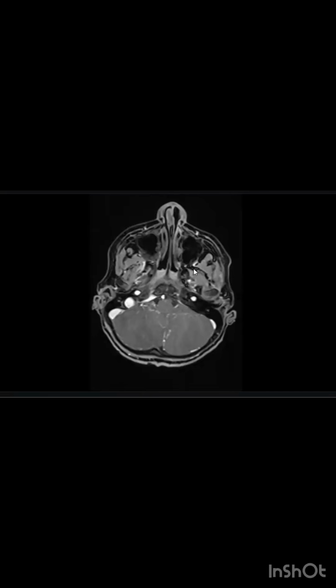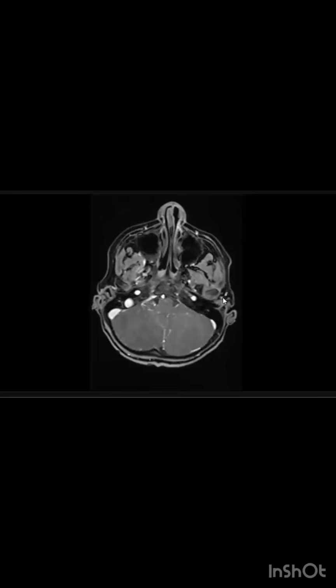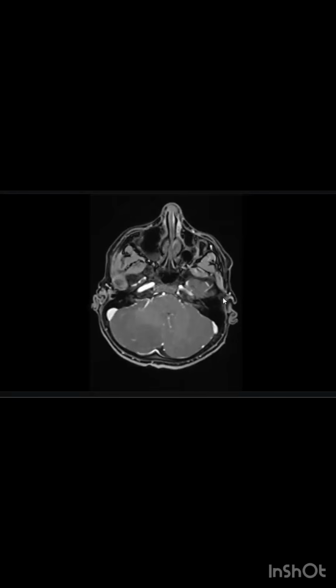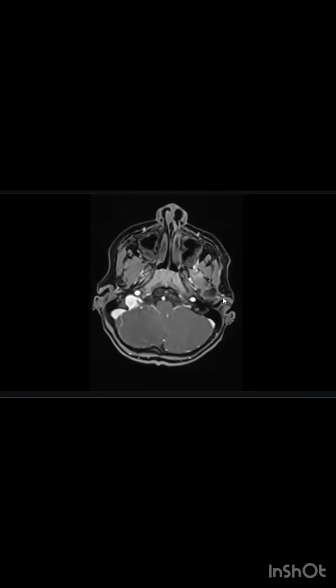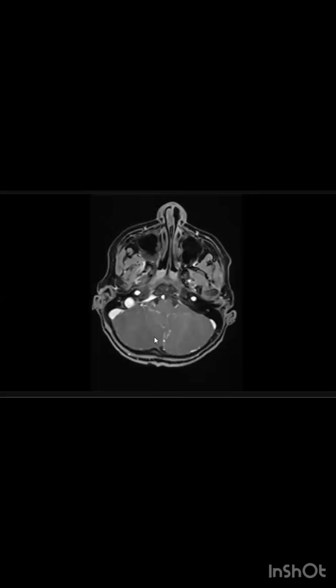Yes, now looking at it. Take your time, no problem about scrolling. Okay, now I'm looking at the right cerebellar hemisphere again in the post-contrast sequence, where I can only appreciate that there is subtle leptomeningeal enhancement noted. So if the patient has any history, as the patient was having a history of fever, the other possibility could be cerebellitis here.